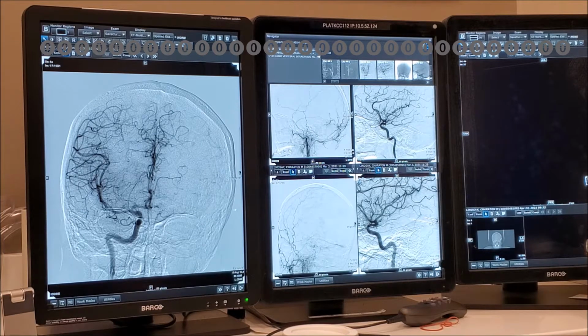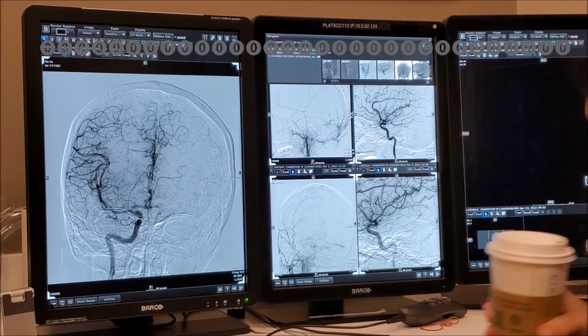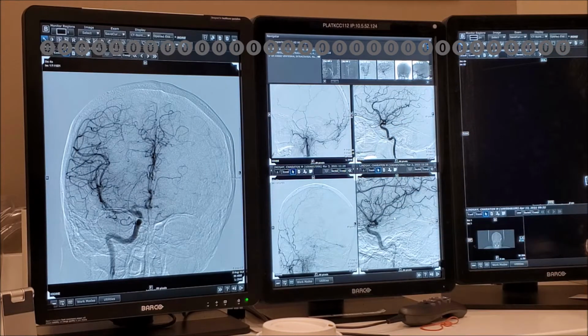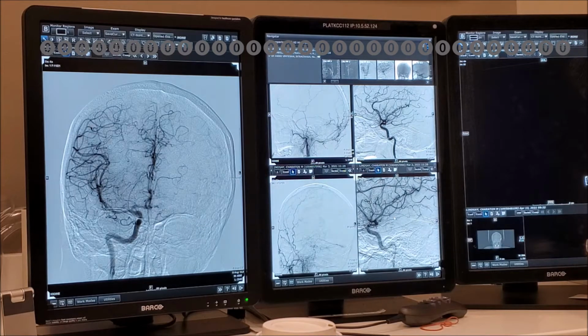Now, for the most part, what diseases would make this vessel become big? Dural AVFs. Absolutely, what else? AVMs. Meningioma. AVMs can be dural, but for a cerebral AVM to have this branch is unlikely unless it's got dural contribution, right? But meningiomas, correct. So things that happen in the meninges. Okay, but it immediately tells you that.